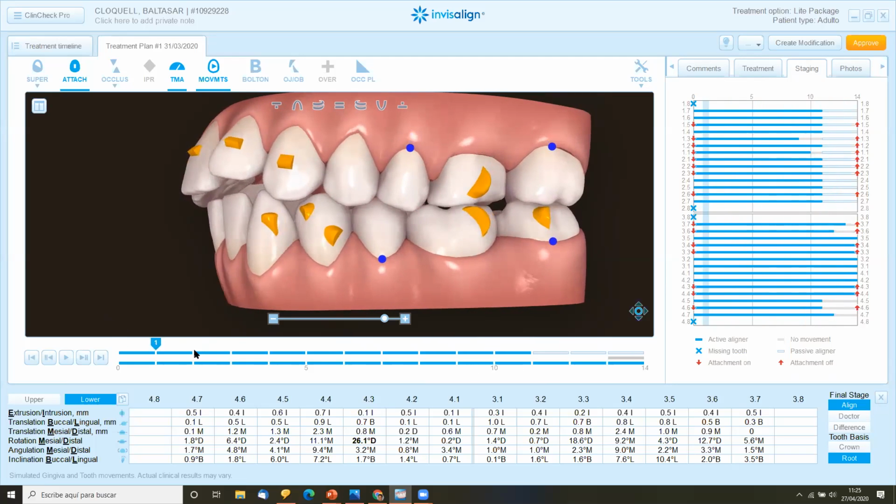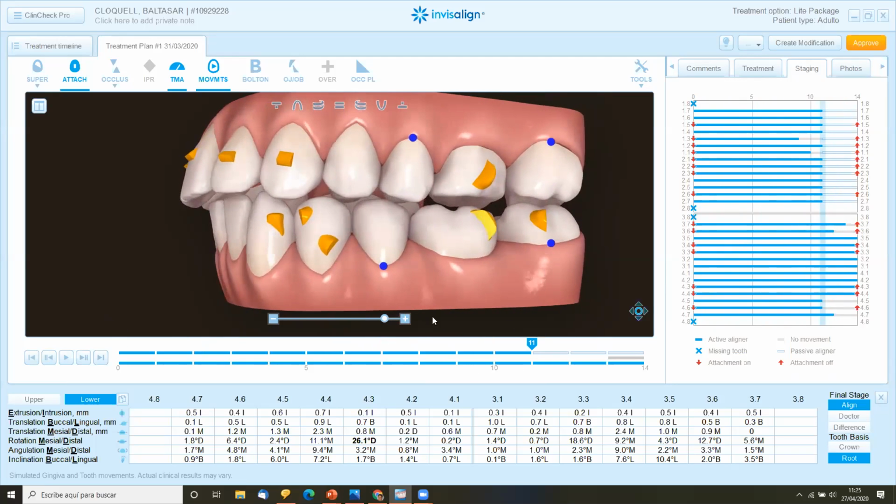Okay, so there's no other way. Maybe in some cases I have to admit a bit of round tripping, but in 99% of the cases, I avoid them completely. Okay, with that being said, let's move on. Okay, I see no interferences, but what I see is, of course, the virtual jump.